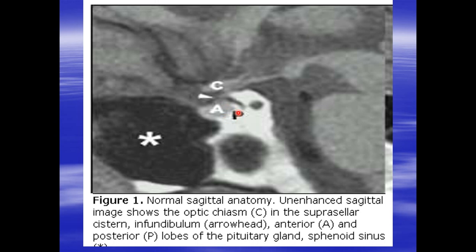pituitary gland, and if we don't see the hyperintense bright spot, then we definitely have a pathology, most likely diabetes insipidus, because this posterior lobe is responsible for the secretion or regulation of the antidiuretic hormone. So when there is no bright spot, no posterior lobe, no antidiuretic hormone, there will be very frequent urination, in a large amount, which is the pituitary diabetes insipidus.